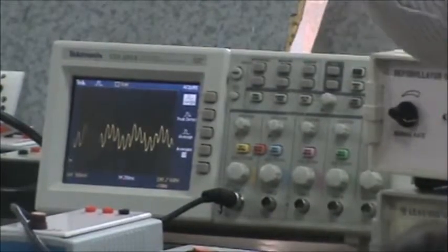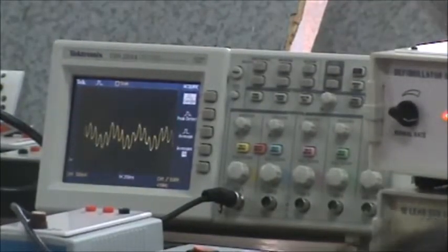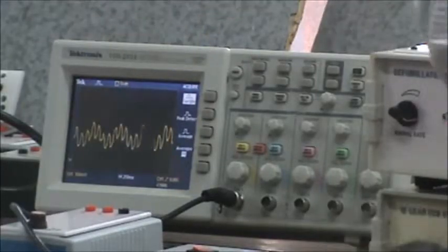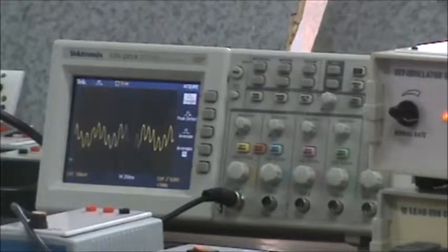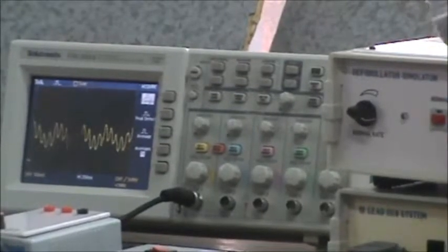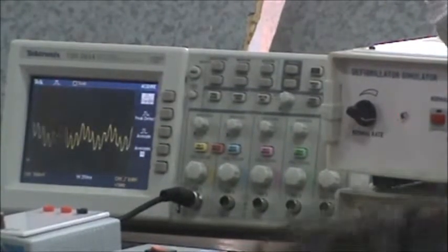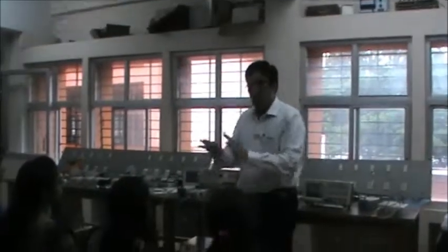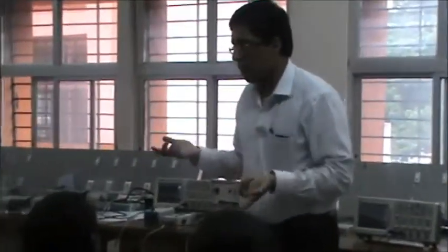You would have found them in railway stations, airports or malls, where even a layman can use them. A normal defibrillator needs a paramedic to come and use it. With an AED, a voice prompt tells what has to be done. Just connect the paddles, don't touch the patient, and the machine takes over from there.